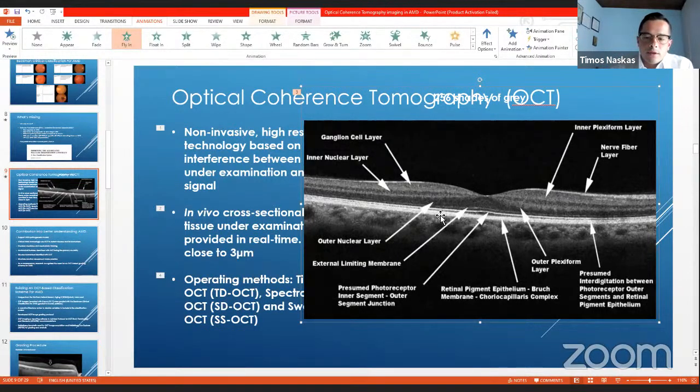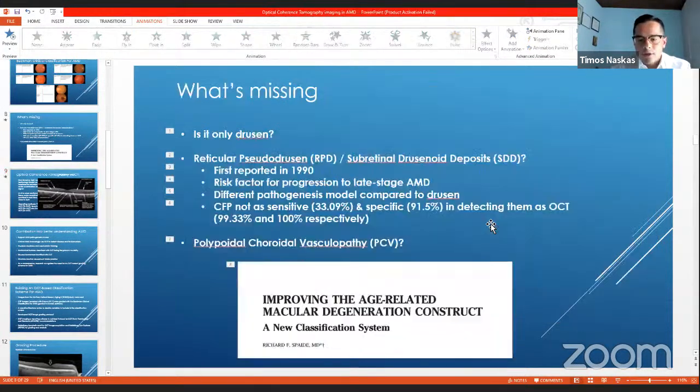The only thing is the outer retina, the photoreceptors and the RPE, which need to be well distinguished, and also Bruch's membrane, which is at the very bottom, and it's a single layer, and it's very thin. So that's where some attention needs to go.